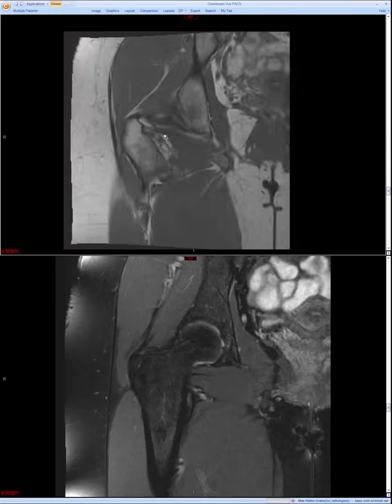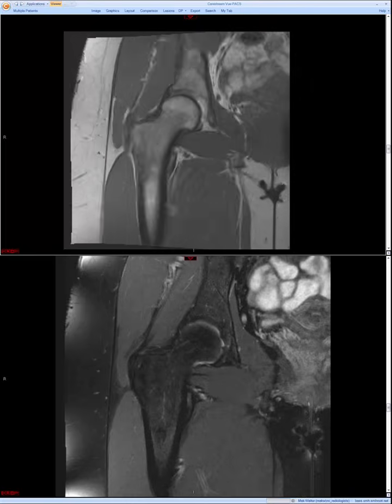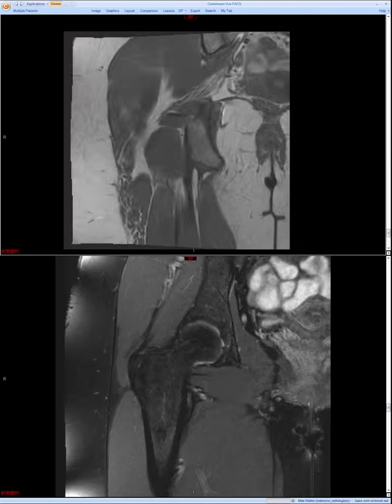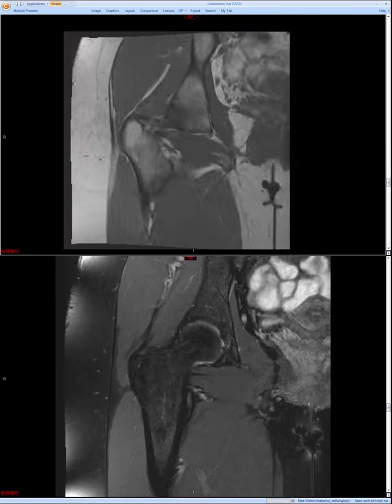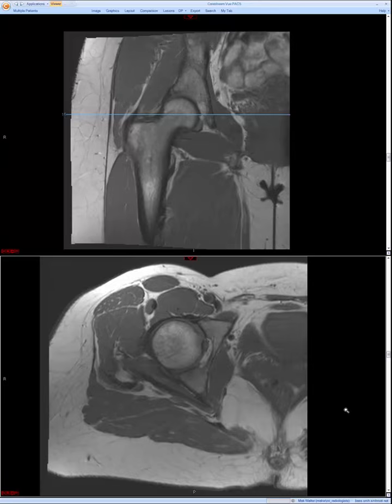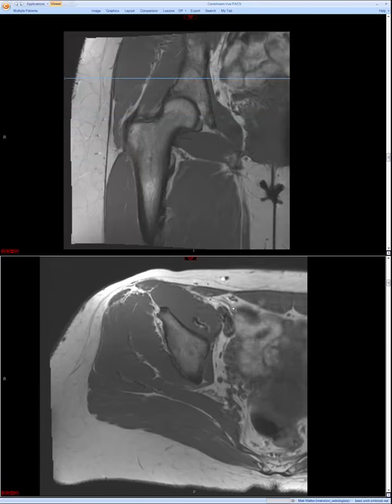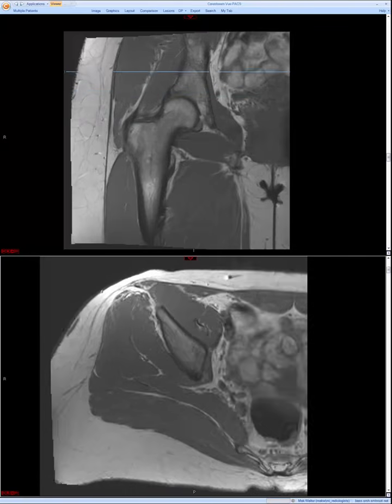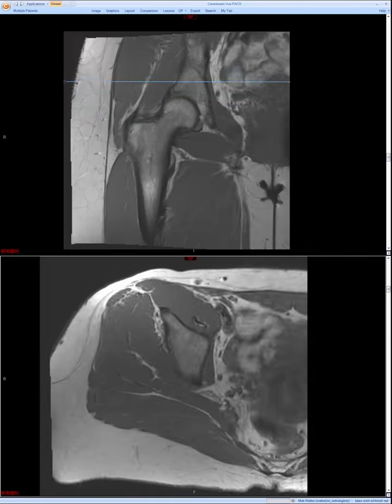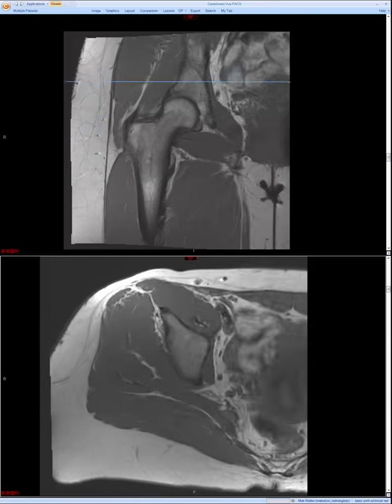This is a kind of analysis that over time would just take a couple of seconds, but if you're just starting out, the heterogeneity of the marrow may surprise you quite a bit. And then once again, because we are radiologists, also look at what we see of the pelvis, and I'll grant you we often don't see much of the pelvis, but the thing that I worry about the most is adenopathy and adnexal masses, and so on and so forth.